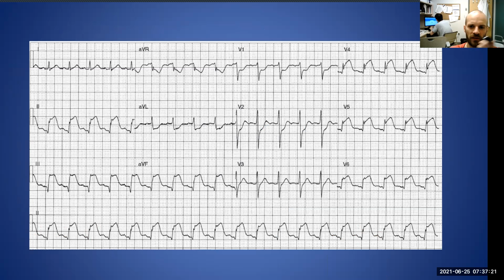Okay, we're just going to look through a few examples here to confirm what we've gone through. So here, once again, we've got an ECG showing a sinus rhythm. It's going a little bit quickly. We've got ST elevation. The ST elevation is mainly present in leads 2 and 3 and AVF, also in V4, V5 and V6, lots of ST elevation. We have some reciprocal ST depression in V1 and V2 and AVL.